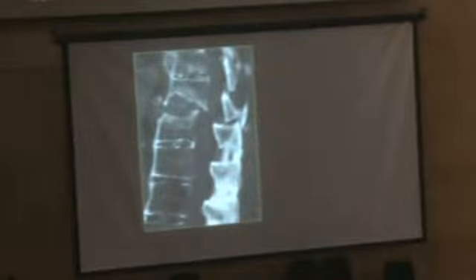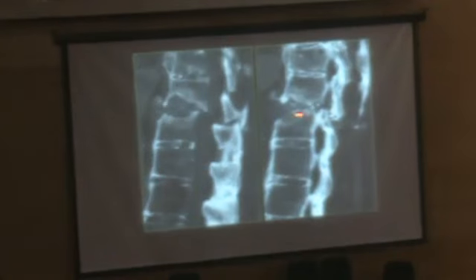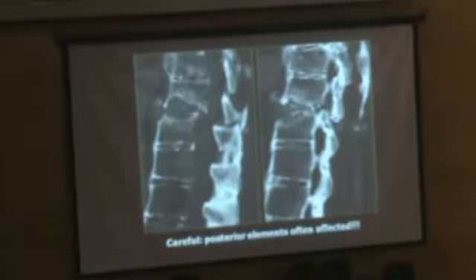This is the same example I showed you, the X-ray. Now we perform the CT, and on CT we can see better an involvement of the posterior elements. And this is an emergency. This is very important. So we cannot overlook those fractures in these patients. So be careful with the posterior elements.